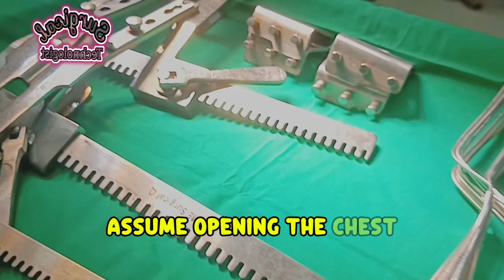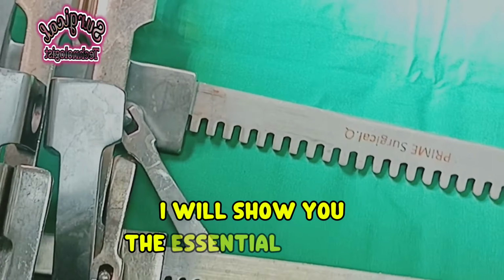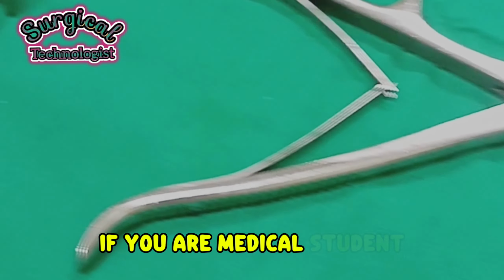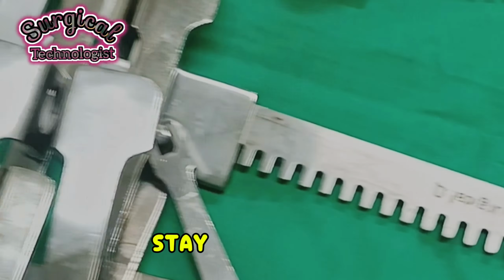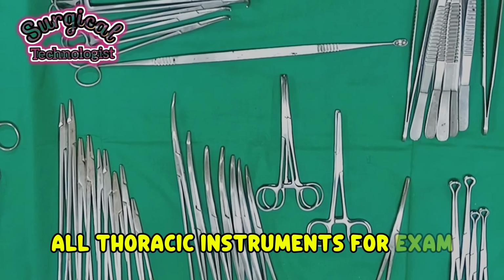Assume you are opening the chest cavity during chest surgery, but you don't know which instrument to pick first. One wrong choice can slow the entire procedure. In this lecture-based video, I will show you the essential basic thoracic surgery instruments every surgical student must recognize. If you are a medical student or surgical trainee studying thoracic surgery, these instruments are mandatory to know. Stay till the end, because I will show you a simple trick to remember all thoracic instruments for the exam.